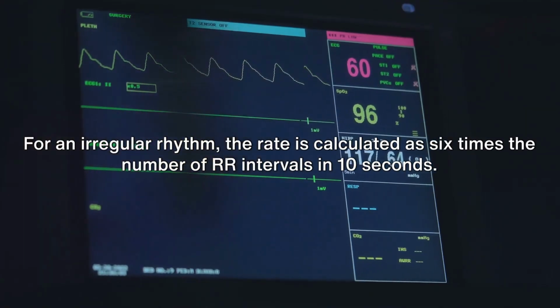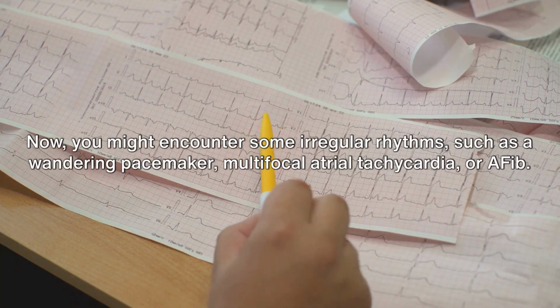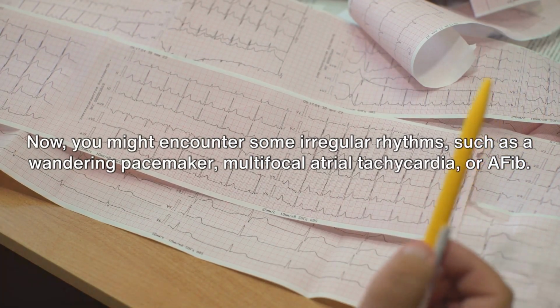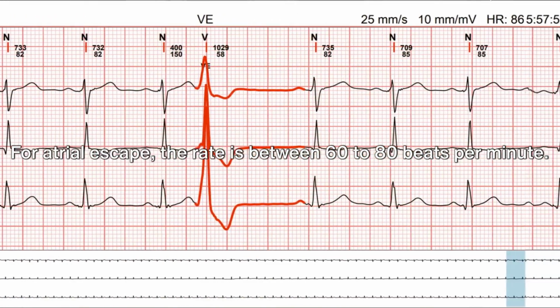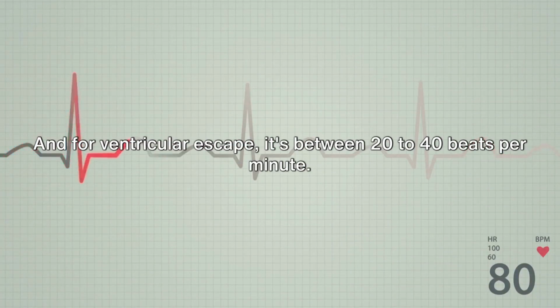For an irregular rhythm, the rate is calculated as 6 times the number of RR intervals in 10 seconds. Now, you might encounter some irregular rhythms such as a wandering pacemaker, multifocal atrial tachycardia, or AFib. And then there are escape rhythms. For atrial escape, the rate is between 60 to 80 beats per minute. For junctional escape, it's between 40 to 60 beats per minute. And for ventricular escape, it's between 20 to 40 beats per minute.